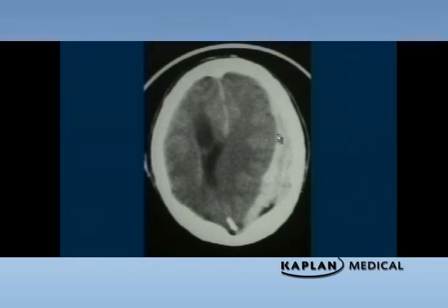Because this is a huge, massive subdural hematoma that has caused brain herniation. In other words, it's not whether it's a subdural or epidural that tells you whether or not you're going to herniate. It is whether it is larger or not. The larger one is worse. So, this subdural hematoma pushes the brain over.